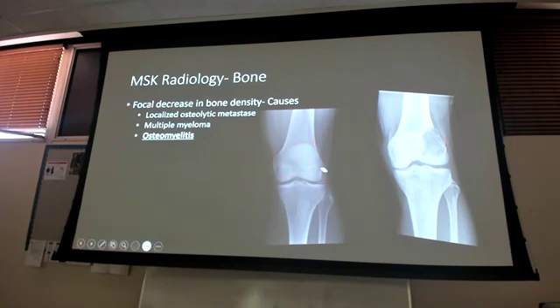I'll do all of that, and everything's intact. I don't have any fractures or anything going on down here, doing my tracing, looking at my medullary canal, everything looks good. But then I have this huge radiolucent decrease in density right there sitting in that tibia. What is that? What that actually is, that happens to be the first one. It's a picture of a localized osteolytic metastases, right? Osteolytic means it's decreasing that bone density.